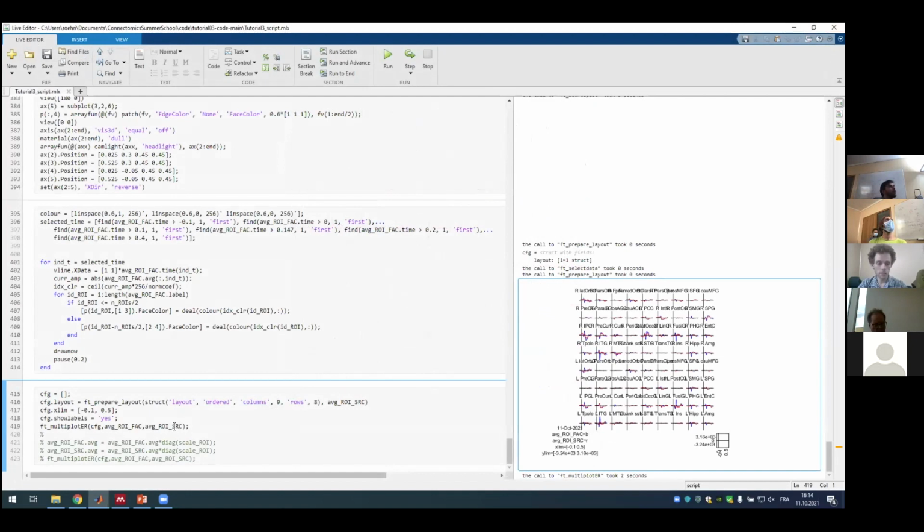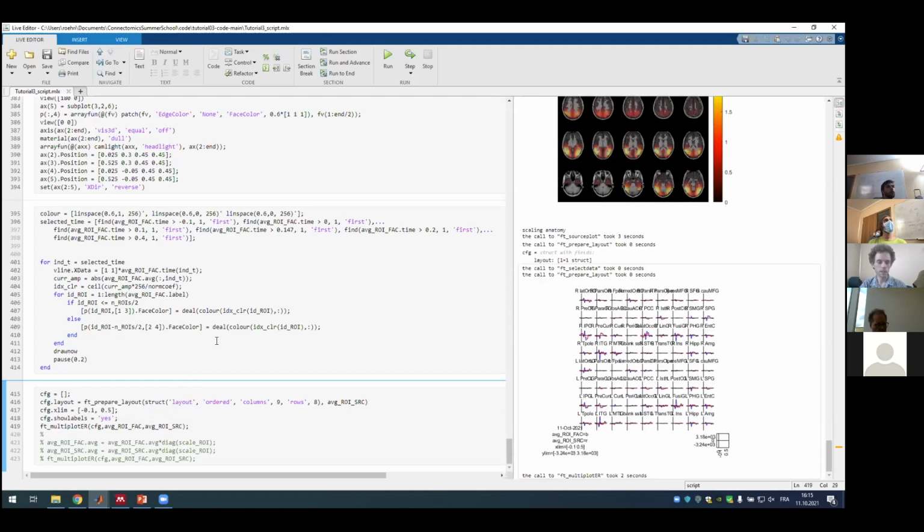And that's it. Basically, we store all the traces from the ROIs and all the trials. So that's afterwards. Maria tomorrow will show you how, using that, you can use the time variant connectivity to estimate the connectivity across time for this task.